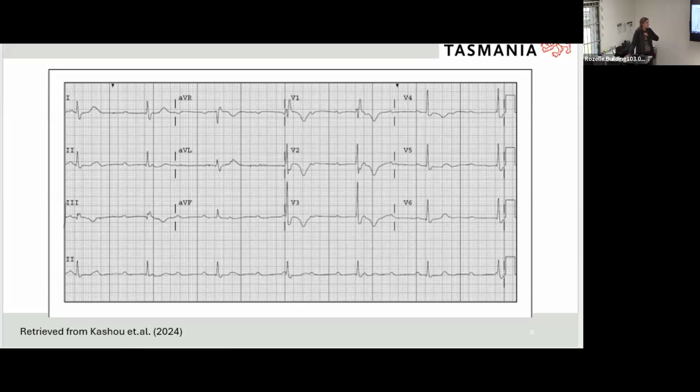So obviously, if we're looking at a left bundle branch block, then we're looking at the opposite. We're looking at that patterning happening in V6 and not happening in, or the slurring in V1. Width of the QRS is also important, as you said. Yes, sorry, Anita, I forgot to point that out. So in particular, we're looking for these bunny ears.